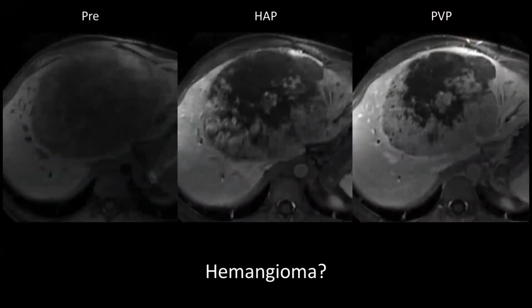So here's a case that was read by a board-certified fellowship-trained radiologist as a hemangioma, no differential diagnosis. So this patient was diagnosed with hemangioma. But if you look at this case, it sort of looks like a hemangioma in the arterial phase, doesn't it? We see sort of these puddles of enhancement. They kind of look peripheral. They're sort of matching the aorta in enhancement. This kind of looks like a hemangioma.